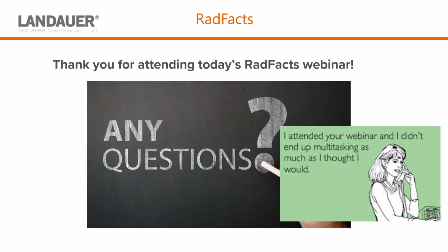How do I know when my data is ready for analysis? The good thing about RadFacts is it's live. Whenever you go in there, that's the data you have at the time. So whenever you have your quarterly RSC, you can log right into that system, and that is going to be the up-to-date data you have. So you may want to schedule your RSCs a little bit past the quarter to allow all the late dosimeters to be returned.